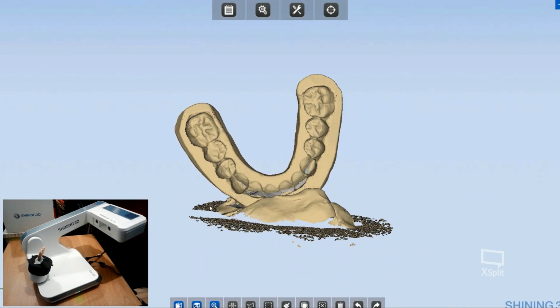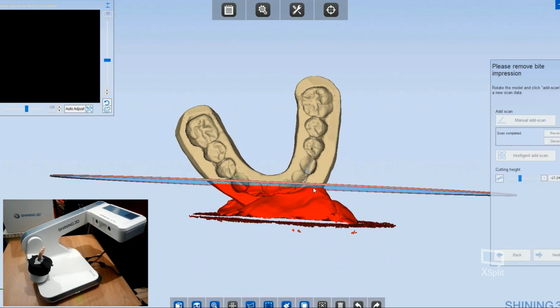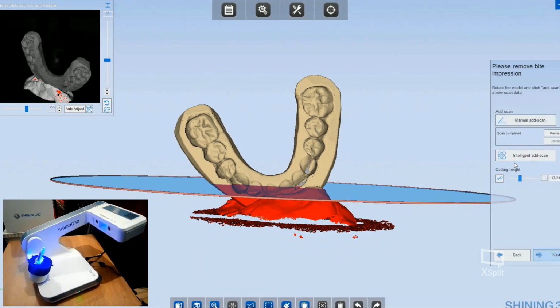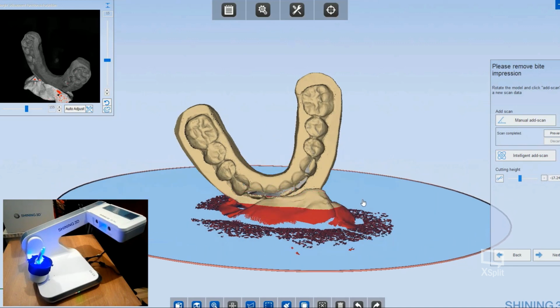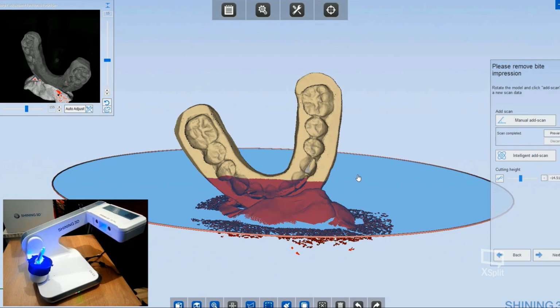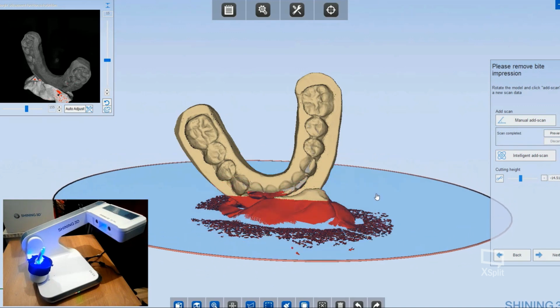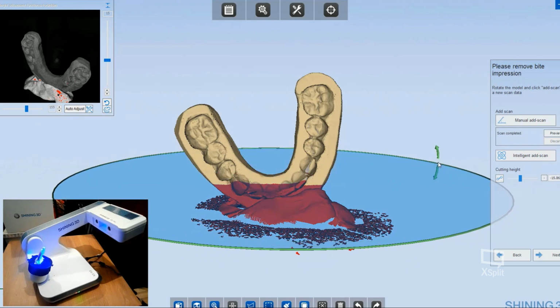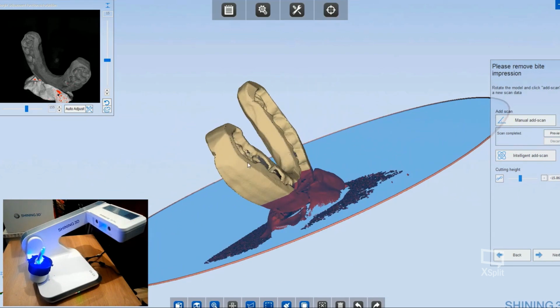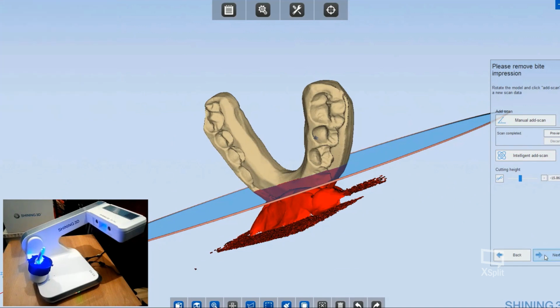At the end of the acquisition, I can decide to add further acquisition, but I'm going to show you how to add further data in the next steps, or I can clean my point cloud by moving and setting the right position of the cut plane. I can move that cut plane by pressing the left mouse button, or I can rotate it following the directions defined by the green arrows, as I'm doing now. Okay, it's okay, I can go ahead.